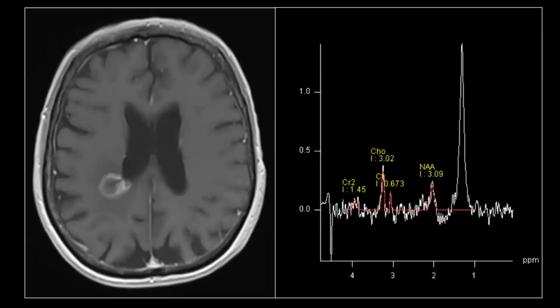If we look at the second lesion, we see a totally different spectroscopy profile. We see a very low NAA, choline and creatine peak, almost barely visible. So whatever is going on there, it's basically a process that's destroying everything. If it was a tumor, we would expect a high choline peak. That the NAA peak is reduced is okay, but we would expect a high choline peak because the tumor consists of rapidly dividing cells, so we expect choline to be increased.